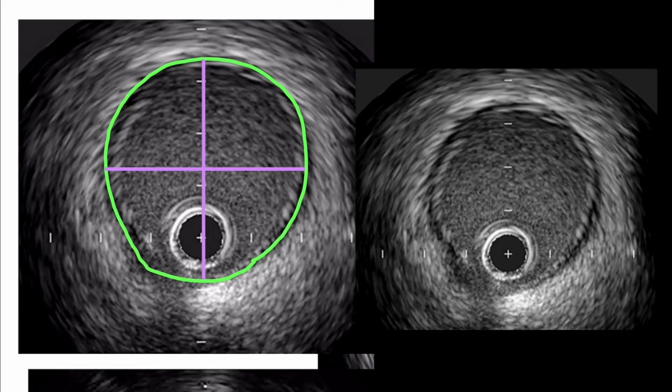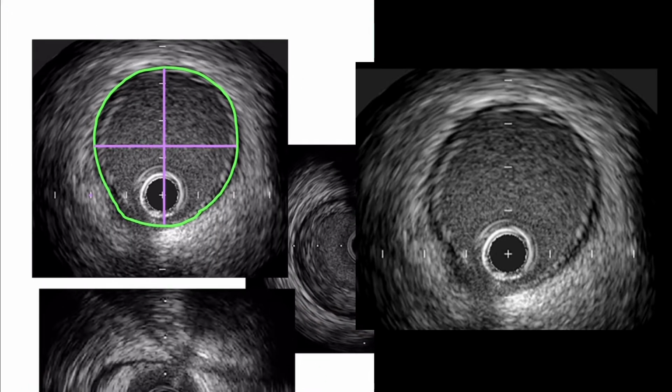The marks are down here, that's okay. This isn't quite a full 1, but neither is that. So we'll say this is 1, 2.5, another 0.5 is 3, so maybe 3.75 that way. There you go. This is a normal healthy vessel.